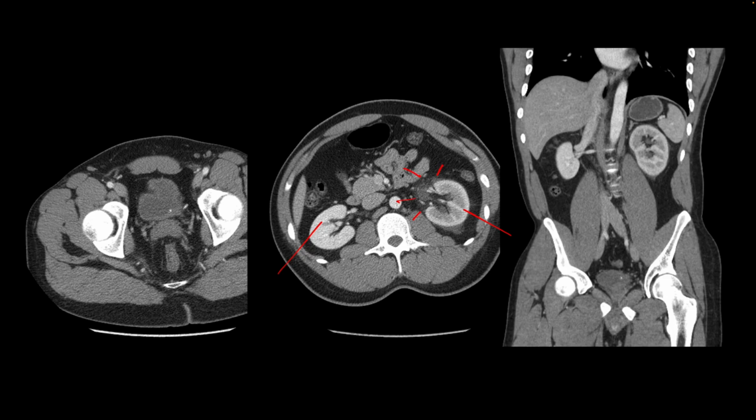At the level of the urinary bladder, we see that at the UVJ on the left side, there is a punctate obstructing stone. The stone, also seen here on the coronal image, is causing upstream hydronephrosis and hydroureter. Because of that back pressure, there is not enough enhancement, and there is possibly some infection, although we don't see any signs of focal hypoenhancement in the kidney to definitely suggest signs of an acute pyelonephritis. So obstructing stone, hydronephrosis, and acute pyelonephritis cannot be ruled out.